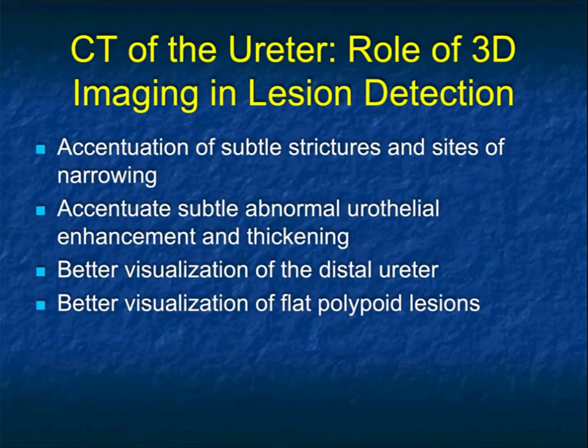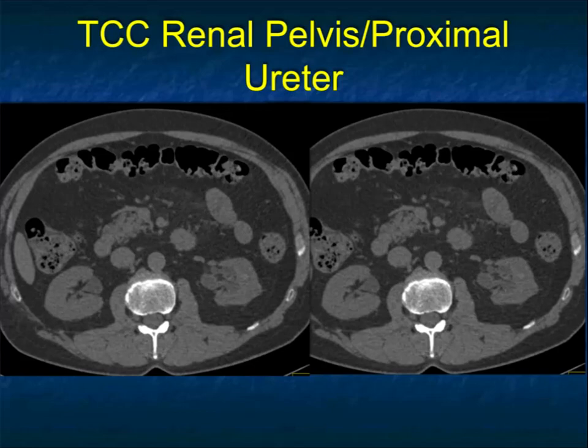The idea about 3D of the ureter, we've published articles about that, but it really can be helpful, accentuating subtle strictures and sites of narrowing, accentuating subtle abnormal urothelial enhancement and thickening, better visualization of the distal ureter, and better visualization of flat polypoid lesions.